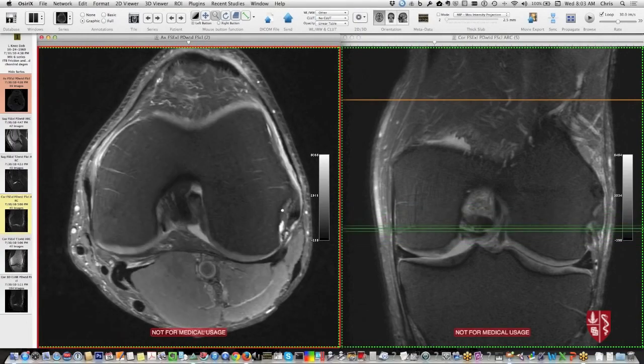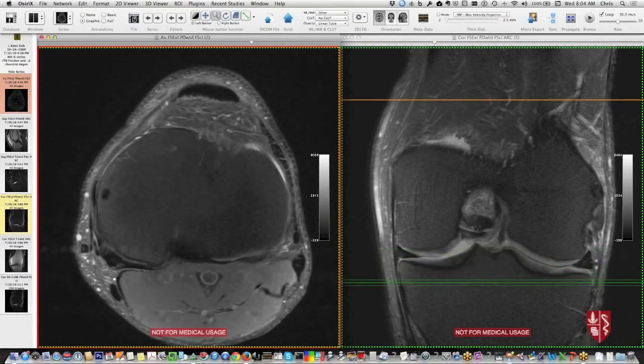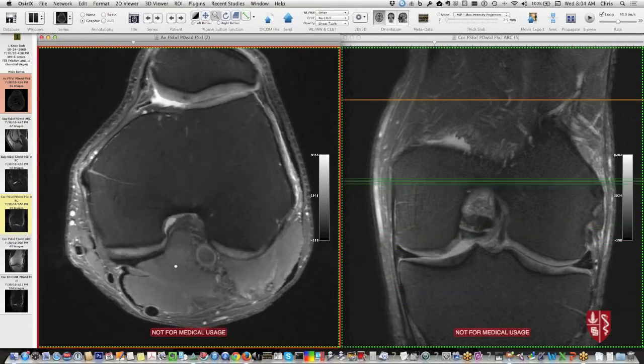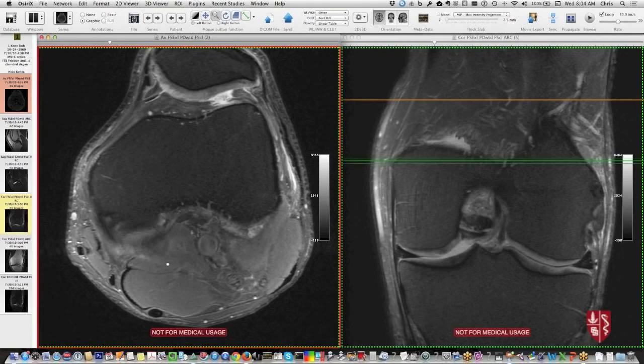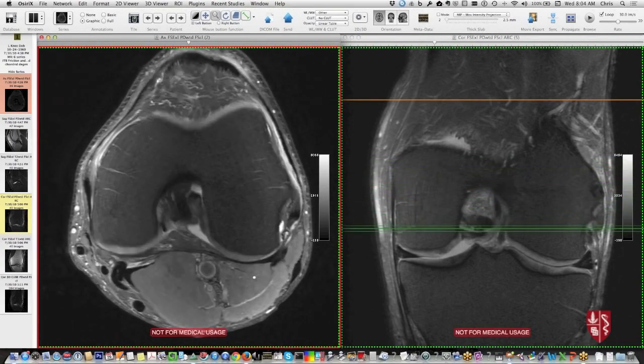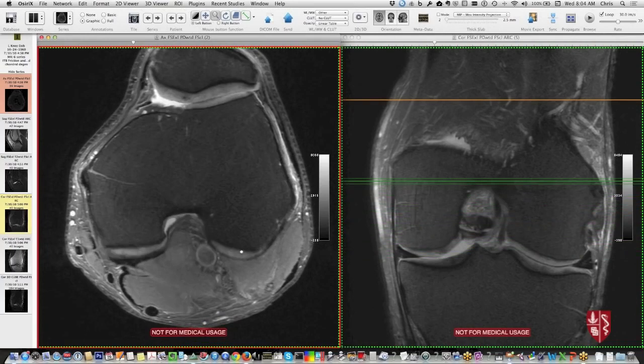Okay. Then we look at some miscellaneous things. Say we've got a good diagnosis. Is there fluid in the region of a Baker cyst between the medial gastroc and semimembranosus? Is there fluid around these tendons, these pes anserine tendons? Looking at the popliteal fossa, look at the gastrocnemius muscles on either side. You could see injury in those, but mainly we're just checking to make sure that the vessels make it through without any deviation or possible entrapment by the muscles. And then the nerves are also here. So this is the tibial nerve and the common peroneal nerve there on the axials.